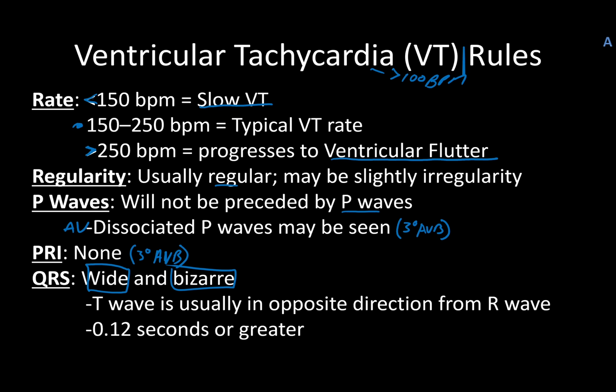Additional things I want to talk about is sustained versus non-sustained V-Tach. So we'll just assume we're right here in the middle and that we've got the greater than or equal to 3 PVCs rule. We've met that. Sustained and non-sustained.